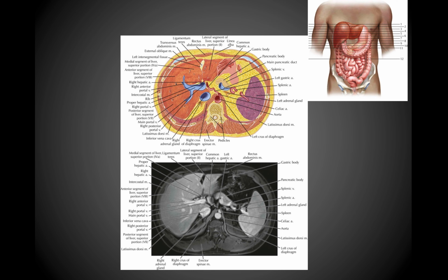And then now in this next image, you can start seeing part of the pancreas. So here you see the pancreas, and a really important relationship on imaging in the abdomen is the pancreas with the splenic vein. So you'll see that cropping up quite frequently. So again, you can see the pancreas here, and then the splenic vein is sort of the somewhat lighter hyperintensity that you see located right around the pancreas.